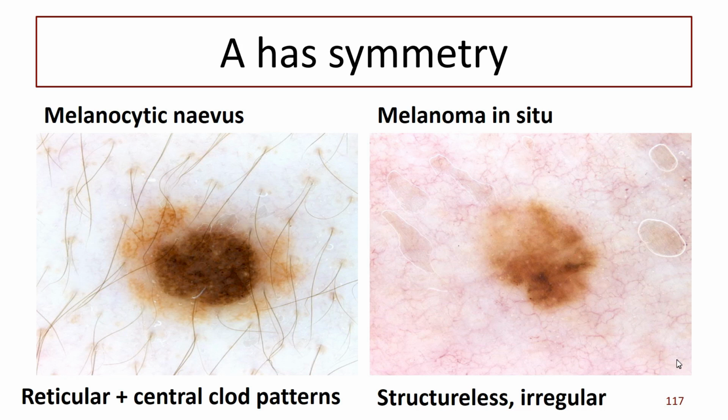So the symmetry of the shape, but that doesn't count. The symmetry of the colours. So here we've got a bit on the edge, so it's eccentric, it's not in the middle. We've talked about darker in the middle being okay. Here we have darker on the edge. Now that on its own wouldn't be enough, but here we've lost the colour altogether.